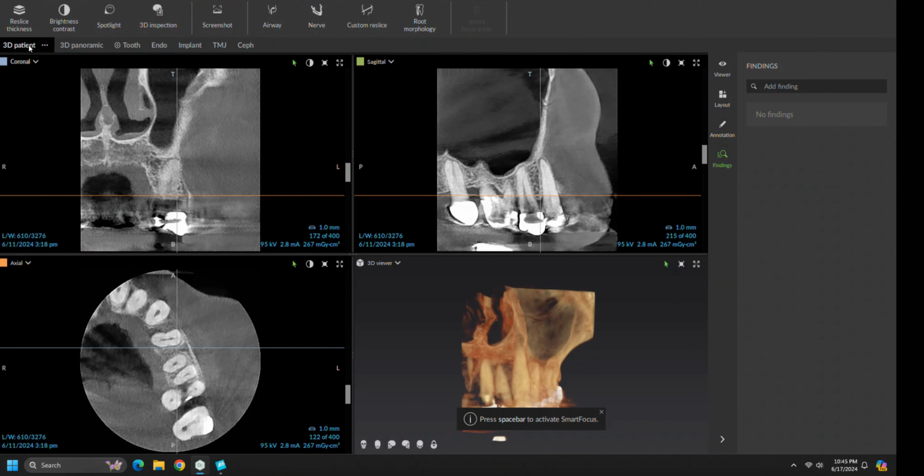Yeah, I'm not able to make a measurement. Still learning how to use the software, but to me that looks like 7 millimeters. So we're in the ballpark of what the specialist had recognized as a deep probing. So we can surmise that this is the crack right here. Let's take a closer look at it. Anyways, this is the line right here.